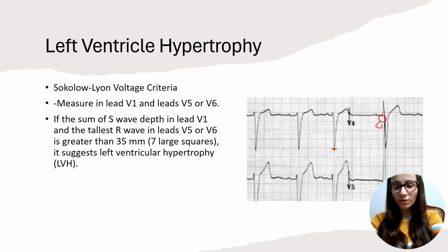And you can just see over here, I'm not going to calculate it because we're missing V1 and all that, but you can just see how tall it is. It's kind of touching the other one, as you see over here.